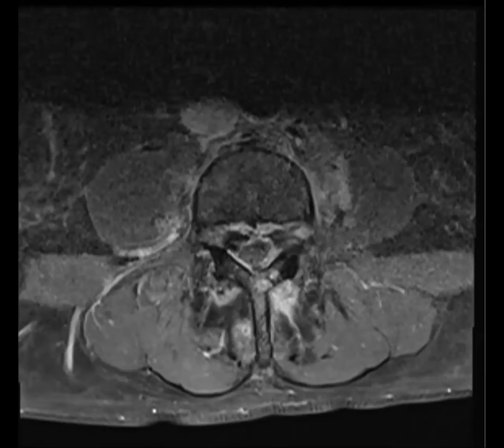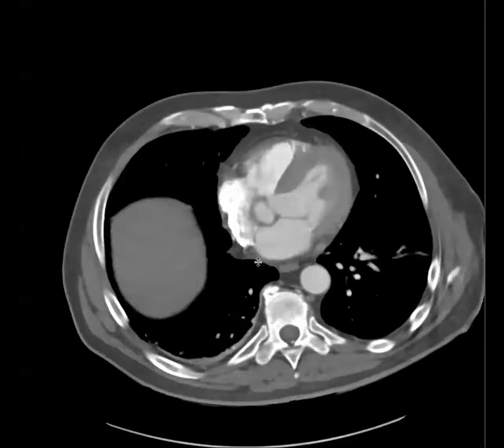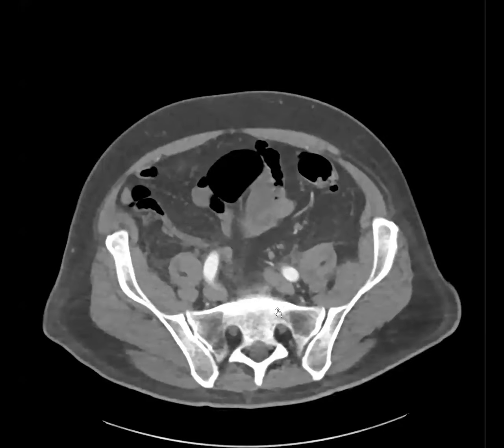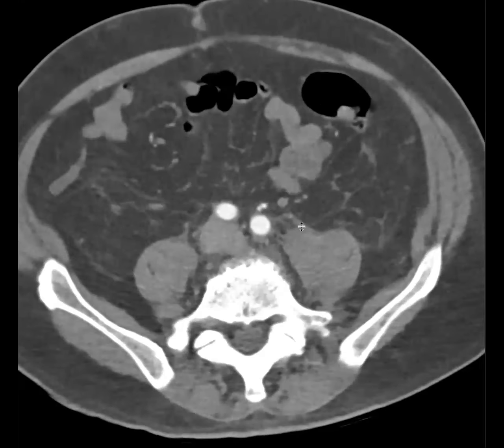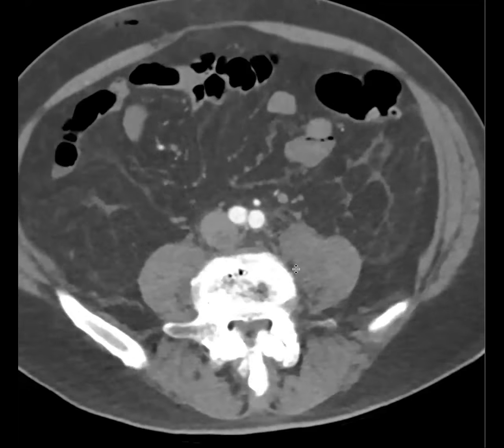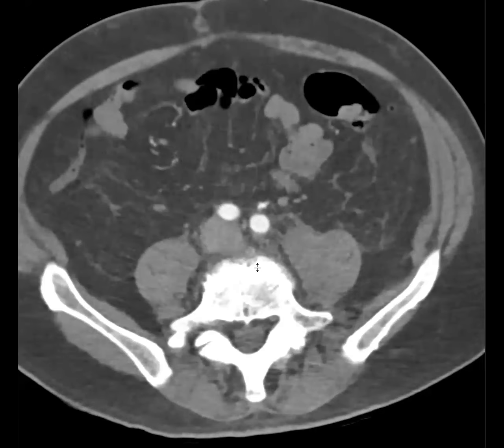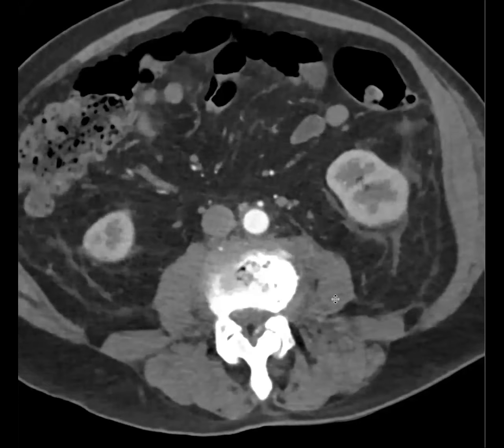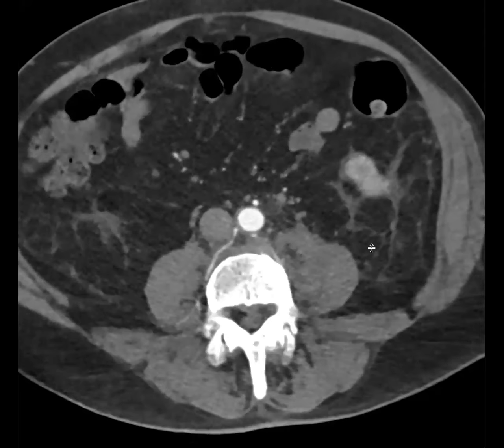And we knew that this was happening in the spine, kind of paraspinous muscles. In addition, they were also looking for vascular complications that are commonly attributed to this organism in human infections. So they got a CTA to look for vasculopathy. On the CTA, we see lots of stranding, along where what we saw on MR. Right there, a lot of stranding, and it kind of progressed. And we just got an angiogram because they were looking specifically for arterial complications.